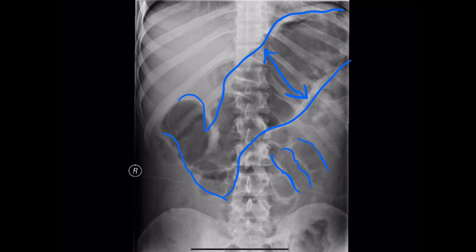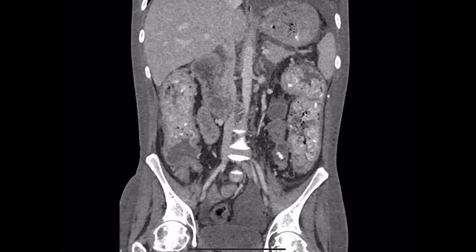One quite nice little point, because we were talking about haustra, is that's a haustral fold there, and believe it or not, that looks a little thick and edematous. I wouldn't have picked that up. Okay. This is a little bit of sigmoid colon, just catching in the corner there. Okay. Colin, thank you.